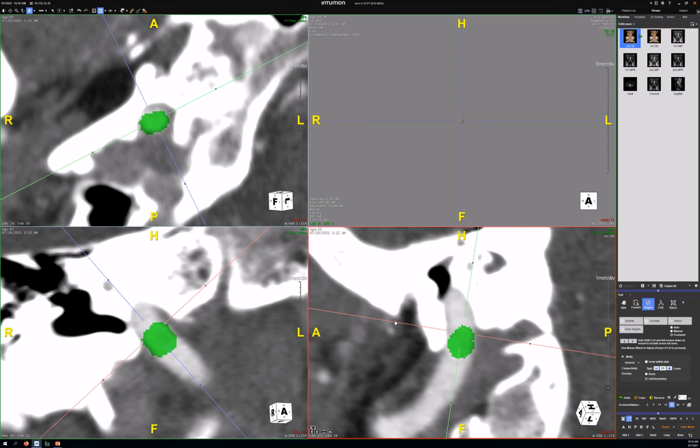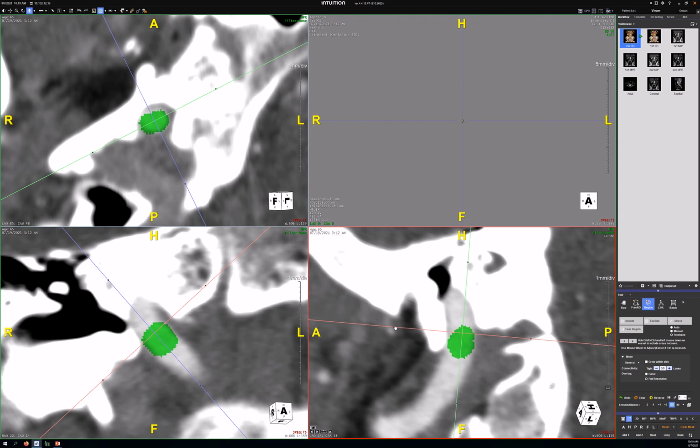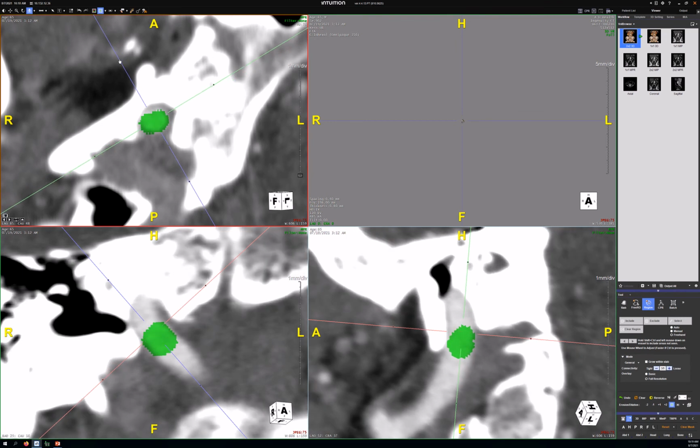Okay, so let's go counter. Is that good? Yeah. And this one still looks okay. Looks okay, and then that one, slight, maybe a few degrees. There we go. Okay, so then do your circles again.